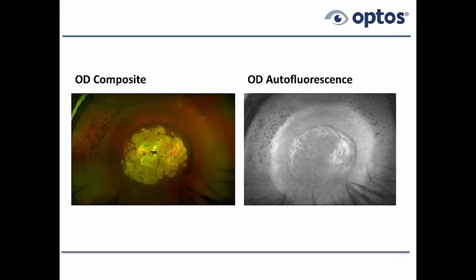This patient actually did have cataracts in addition to this 34 diopters of myopia. But this is not a typical pattern of disc. Most of these discs are actually somewhat darker, as we showed you previously. The vessels usually look a little bit darker. But recall, this is a very pathological eye with an axial length of 35 millimeters with a ton of stretching in this 34 diopter myope.